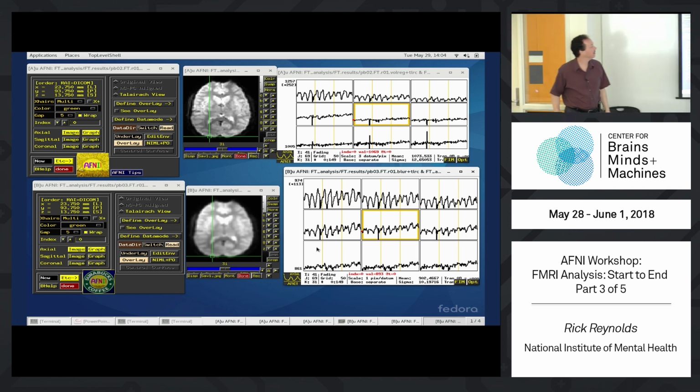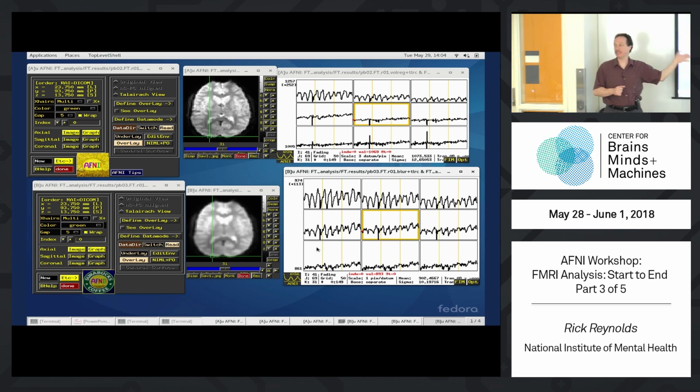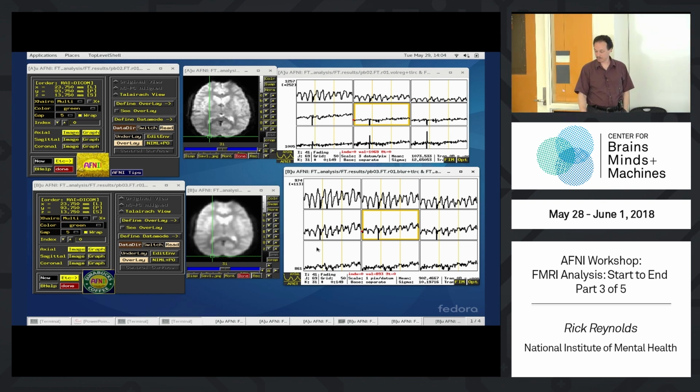it's hard to really say. But that's one of the hopes, right? You hope there's noise cancellation. You hope the resulting time series is cleaner. And this is a small blur too. Remember, this is 4 millimeters. A lot of times, it's much more common to blur by 6 or 8 millimeters, and that will look distinctly more blurry.